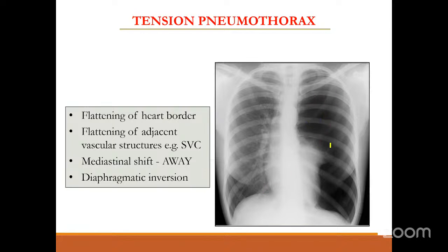And with this pneumothorax, you would usually see the cardiac shadow to the left. So what's happening here? Even your heart shadow is moving towards the right. That means the air inside the chest is under high pressure, strong enough to push the heart to the opposite side. So that is an emergency situation. We need to identify any such condition causing tension within the thorax. Because it arises out of air, we call this a tension pneumothorax.